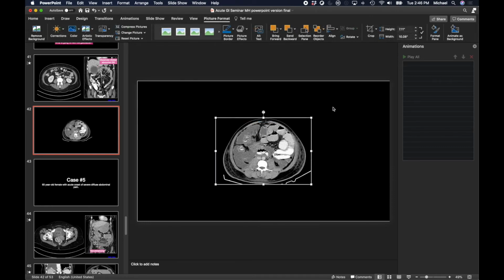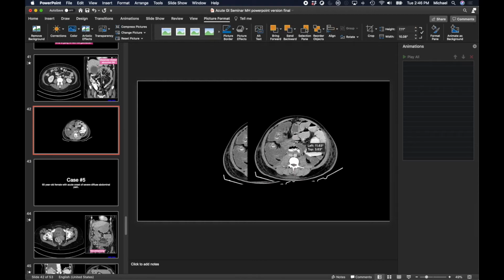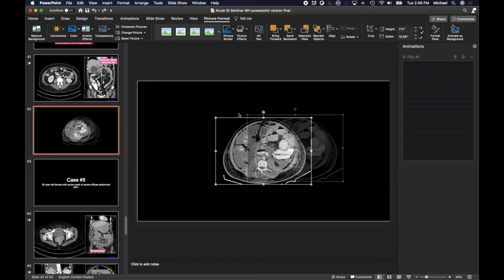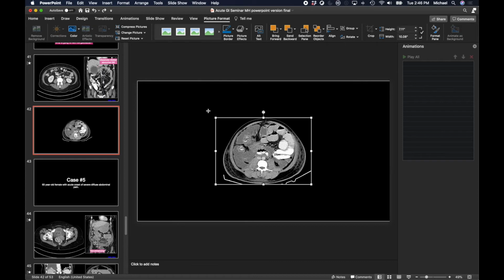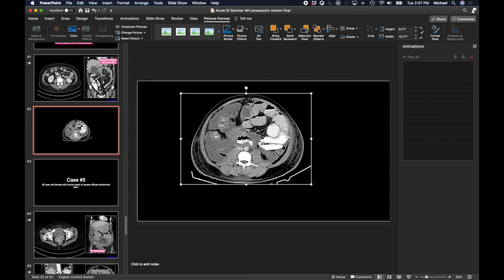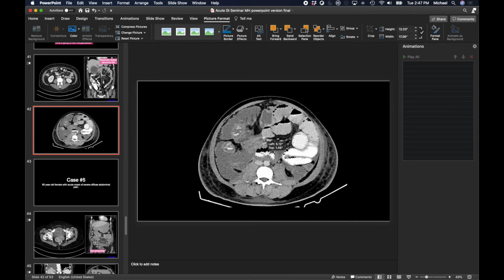After you do that, you might need to give it a few seconds, and when you want to resize or manipulate the images, just make sure you're not grabbing just the top image, which is oftentimes what someone will do without realizing that not all of them are selected. So in order to make sure you're always manipulating all of the images, I hit Command A to make sure they're all selected. Then I can enlarge them, which is enlarging all of the images at once and takes a few seconds. Drag or drop or pull this to different parts or center of the images.